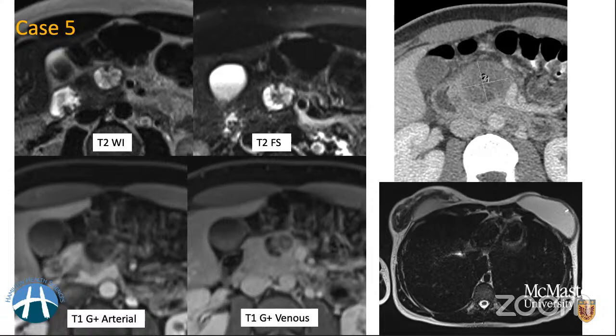So remember that pancreas is not a common site for metastases, but you may see metastases in pancreas once in a while. Like I have seen mets from melanoma, mets from lung carcinomas, and breast cancer to land in the peripancreatic region or within the pancreas in periampullary region or within the head. And that's usually the more common site than the tail and body. And this is something which is really important to look at image and then derive your conclusion.